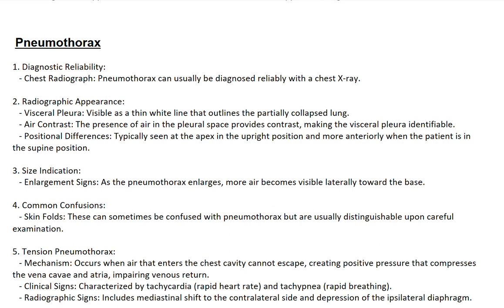Point-wise note on pneumothorax. 1. Diagnostic reliability. Chest radiograph. Pneumothorax can usually be diagnosed reliably with a chest X-ray. 2. Radiographic appearance. Visceral pleura, visible as a thin white line that outlines the partially collapsed lung.